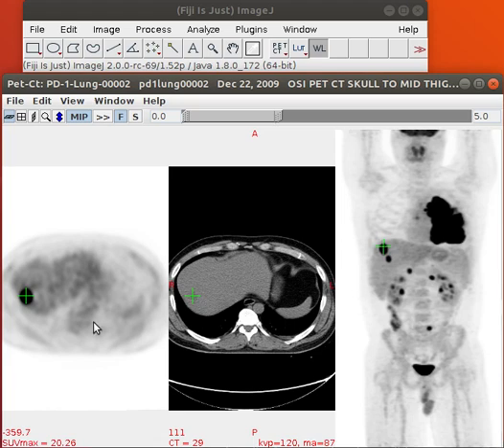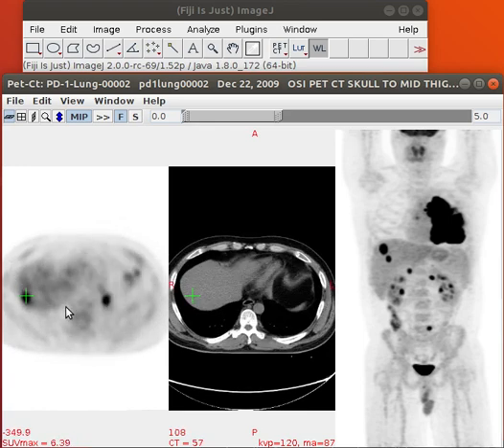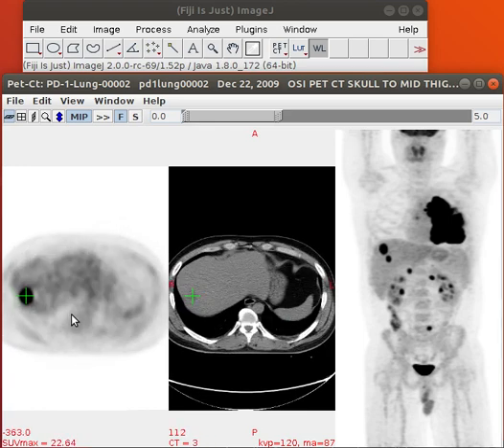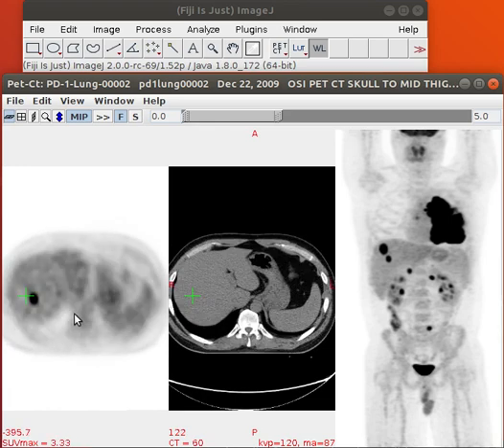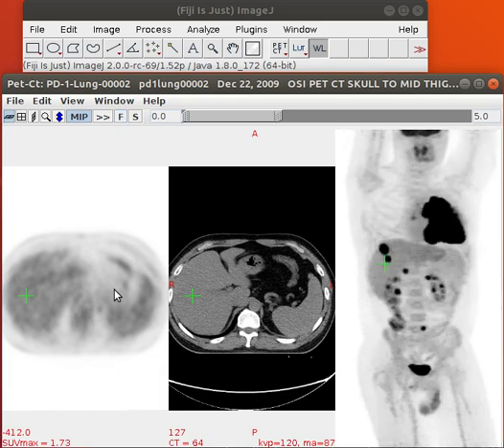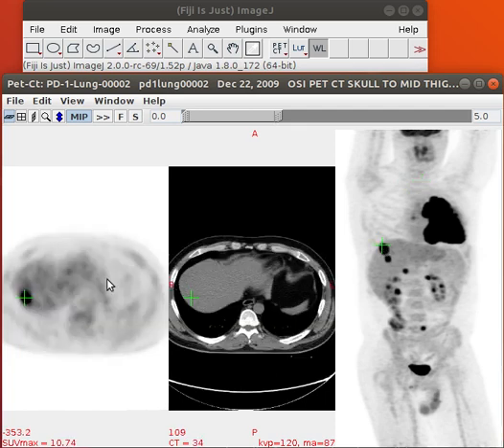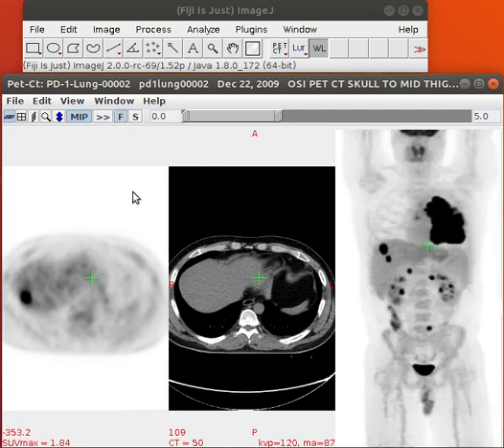You can navigate with the wheel. I can see a couple slices above or below. Or I can do the same thing by moving down slices. I clicked on this while the focus is here. Let me get back to normal. I can put this to the forward mode.